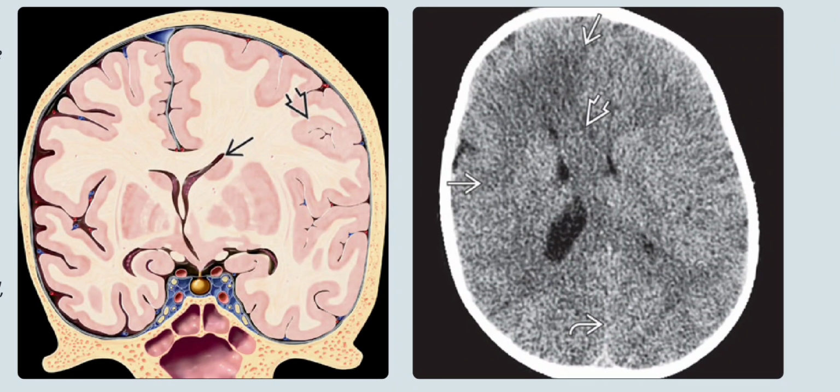So continuing with the brain images and the descriptions, on the left is the coronal graphic, and it shows the overgrowth of the left cerebral hemisphere. Note the shift of the midline structures, excess of white matter, thick flattened dysmorphic gyri, and abnormal ipsilateral anterior horn.